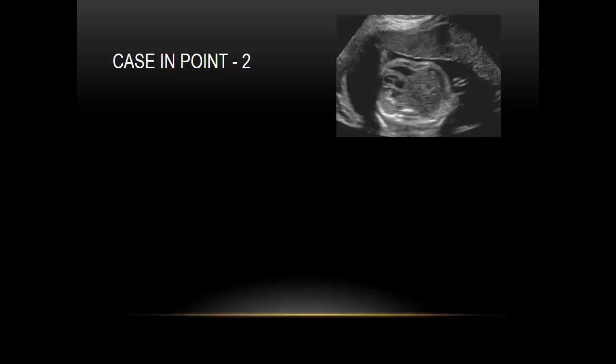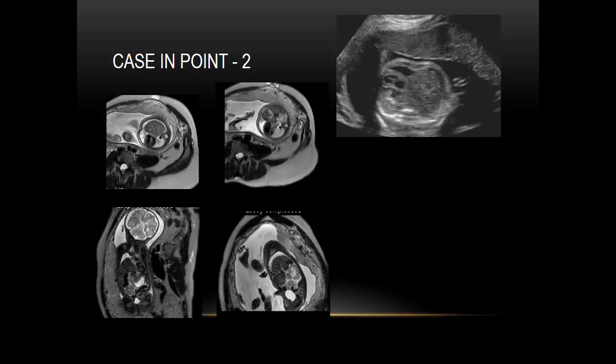the patient. Another case, this is the only non-CNS case that I have. Patient came in with shifted heart into the left side, a little bit of pericardial effusion. So we suggested an MRI. And what did we see on MRI? There was right-sided diaphragmatic hernia. This was not picked up on ultrasound. We saw this on MRI, and this changed the management completely because it was not just a simple pericardial effusion. It was actually a diaphragmatic hernia.